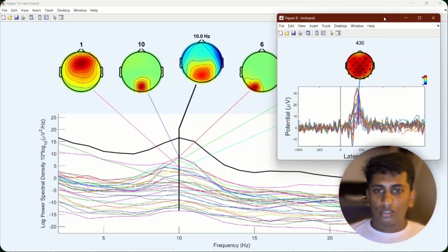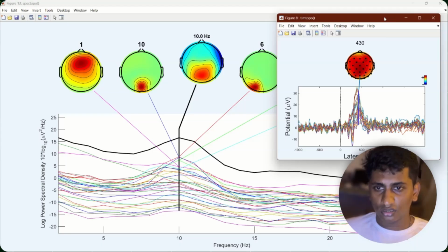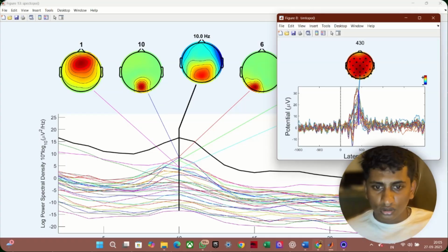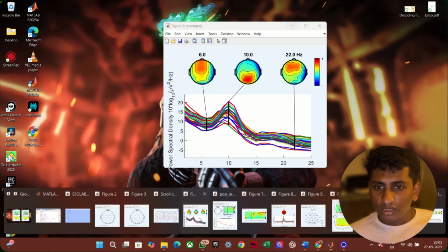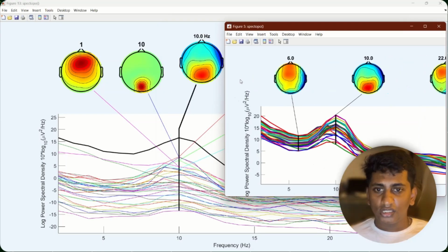Here we have seen the previous data. You can see how specifically we are able to divide. This is done using image processing techniques basically. You can see the difference after the processing, how we are doing. So this is in the time domain, and this is after the processing. I think I can show you the first image. Yeah, this will be a little more detailed in comparison.